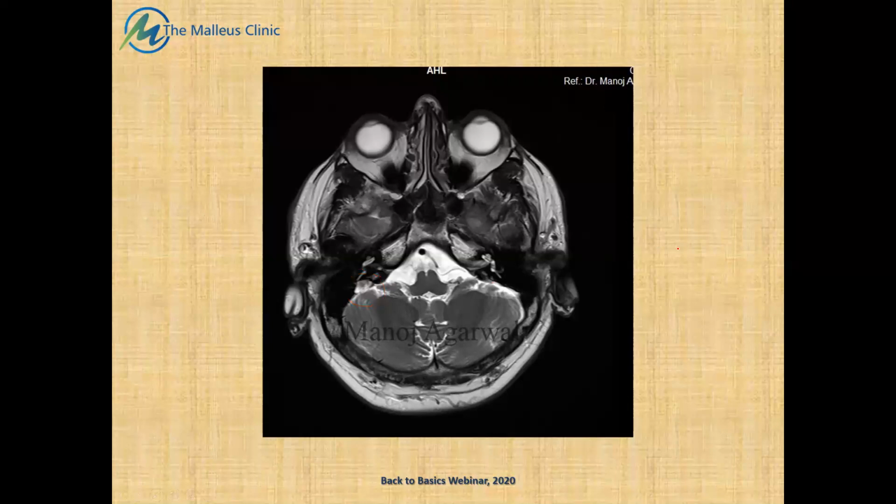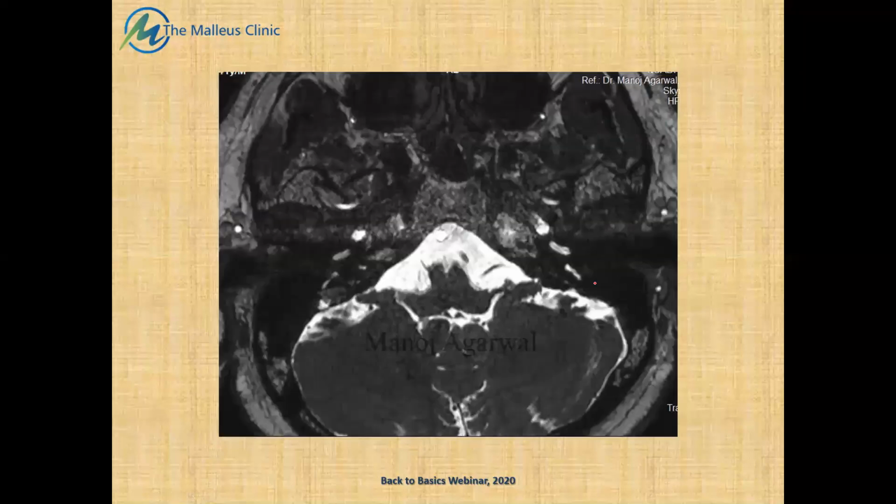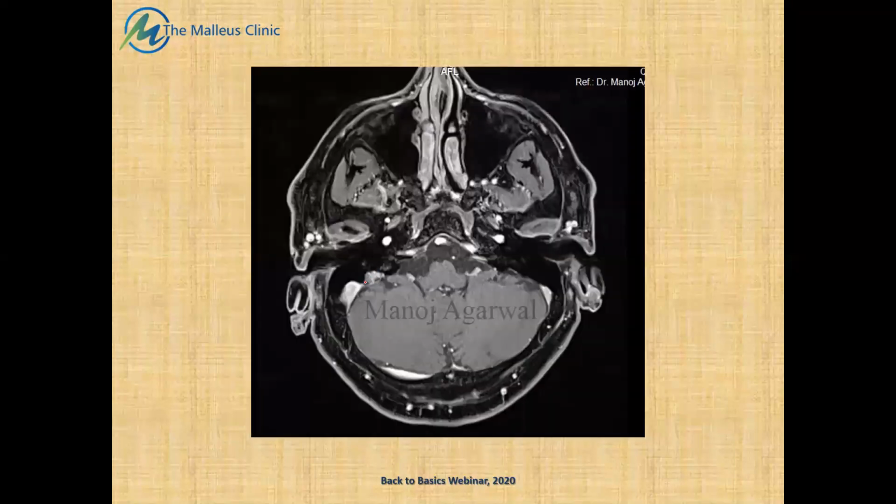Let's first look into the various images. This is another image, and this is a post-contrast image, and you can see the lesion very clearly residing along the posterior face of the petrous bone. You can very clearly see it on the right side, and its close relationship to the posterior semicircular canal, and compare it to the left side, which appears normal. This is post-contrast. You can see the lateral sinus here, and you can see the tumoral lesion in this part of the petrous bone.